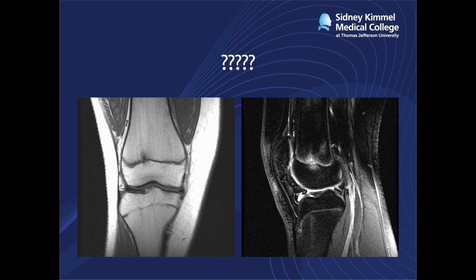On our T1 image, there's just this little irregularity of the physis here with some corresponding high signal on our fluid sensitive sequence. This is what we would call focal periphyseal edema, or FOPE. It kind of looks like a little asterisk to me, sometimes almost like a little dot centered at the physis with little spokes radiating away.